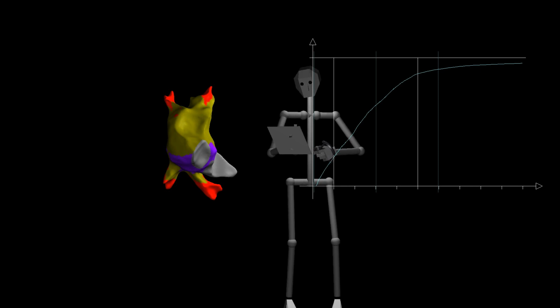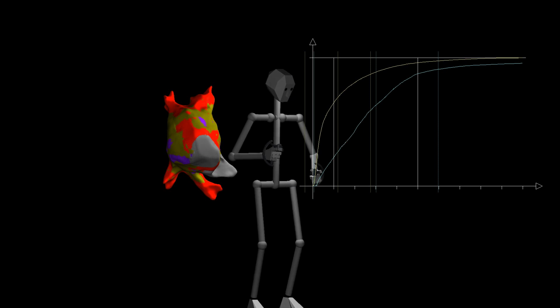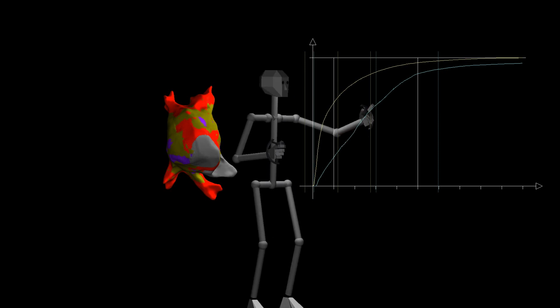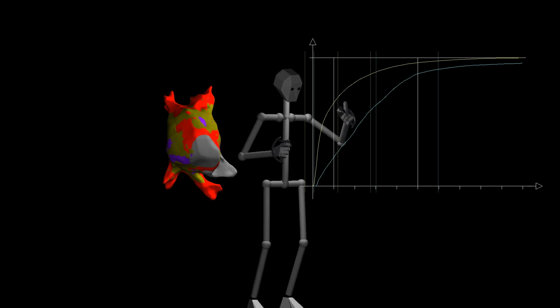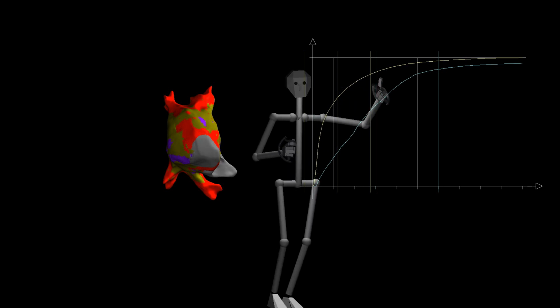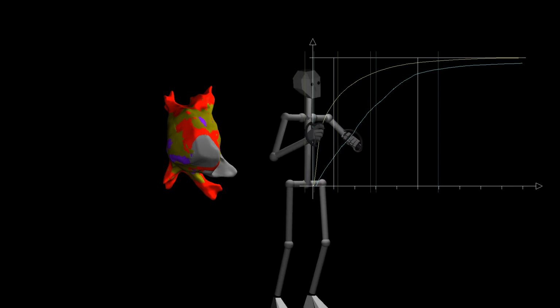scan. If I bring both of these in, we now have the second graph as well. As a reminder, the blue graph here is prior to the procedure, the cryoablation procedure, and the yellow graph here is after. What we're seeing is that the distributions are quite different, and a reminder that this is the bipolar voltage method measured by the device.